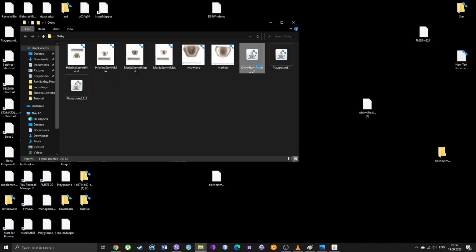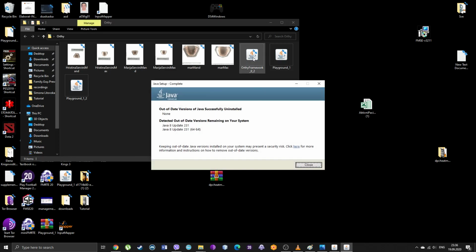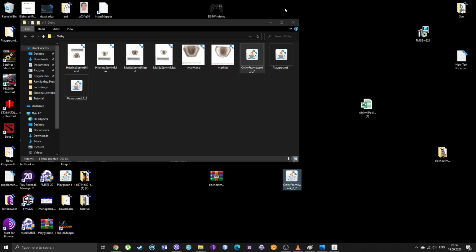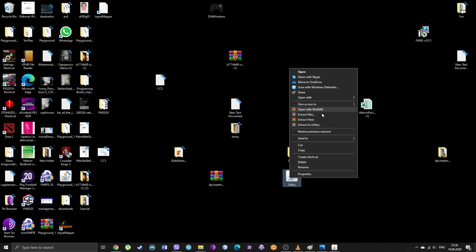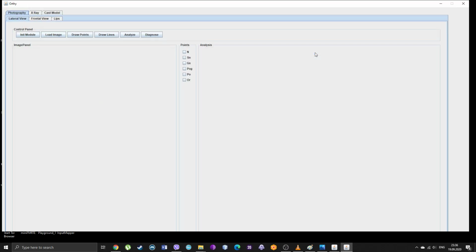Okay, this is the thing. Let's copy it here. I'm gonna rename it first. I'm gonna rename it to Orthy. And you just take this icon here. You're gonna receive it in a zip file. You unpack it, extract it somewhere wherever you like. You just click it, and there you go.